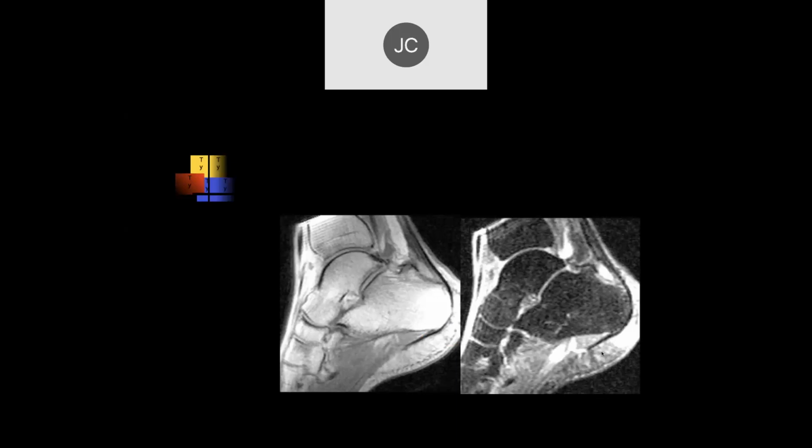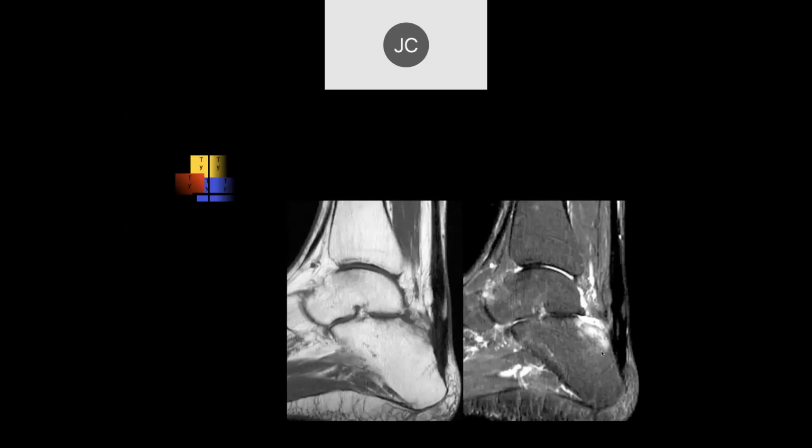What's also interesting, you don't see much skin over that tendon, do you? Usually the skin over the Achilles tendon is very thickened and rough. It's not normal skin that we usually see.